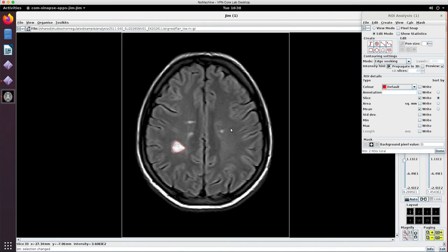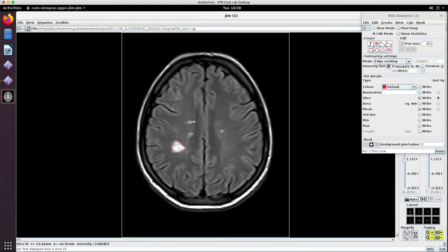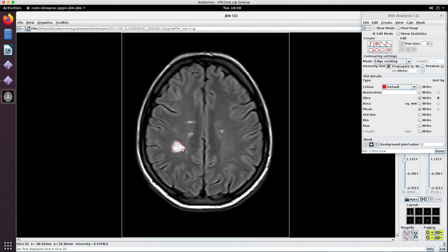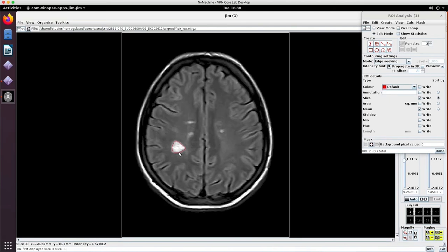So what we're going to do now in the next session is spend some time discussing some of those false positive and false negative areas, because I think you'll probably not have much problem finding these obvious bright areas. You will have to learn how to distinguish, though, all those different things that are sort of special cases. And so we'll go through and deal with each of those in turn.